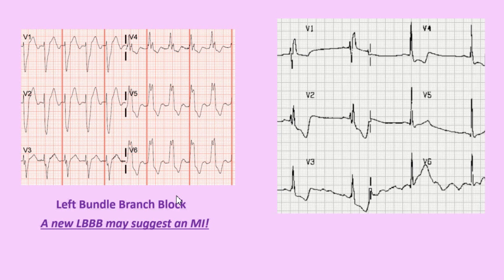And so obviously this one's going to be a right bundle branch block, but let's still work through it. Using William Morrow, we see our M in V1 and a W in V6, suggesting a right bundle branch block. Or we can take our car, put it in V1 going left towards the QRS complex, and we have to make a right turn, so we're dealing with a right bundle branch block.